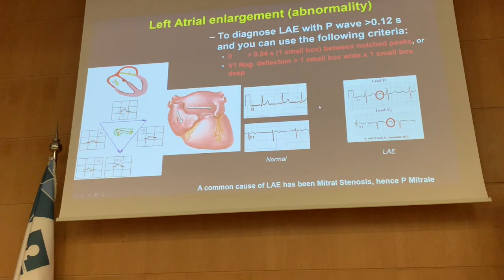You will take these things later on, God willing. So this is the normal patient, and this is the abnormal, which is our patient. What we're going to see here is a P wave, a P wave, a P wave, and a P wave. What are you noticing about the P wave? In simple words, there is something wrong. The P wave here is like two, exactly like two things here.